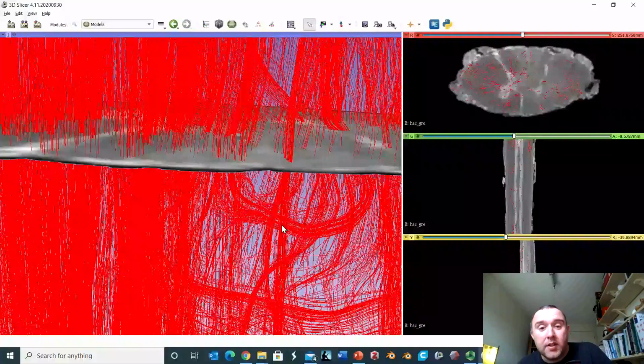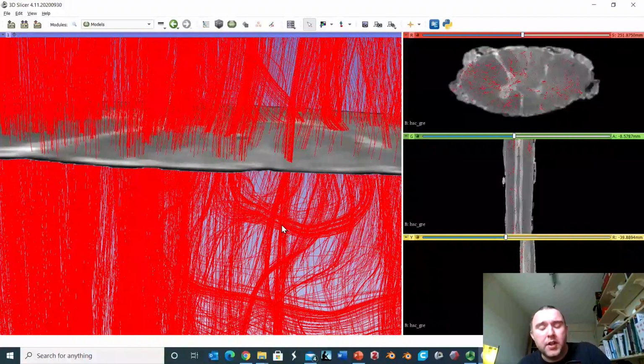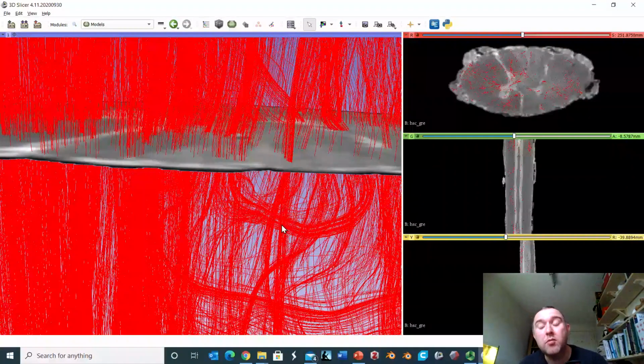And this is actually quite typical from a neuropathological point of view of a spinal cord injury. This patient, however, did not have any clinical history of spinal cord lesions, so it's really quite interesting, and it seems that there were no clinical features of any cord lesion at all in this patient.